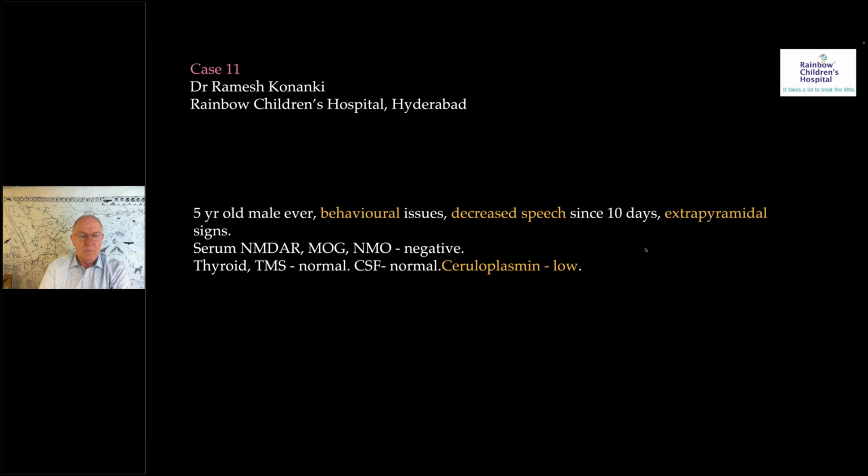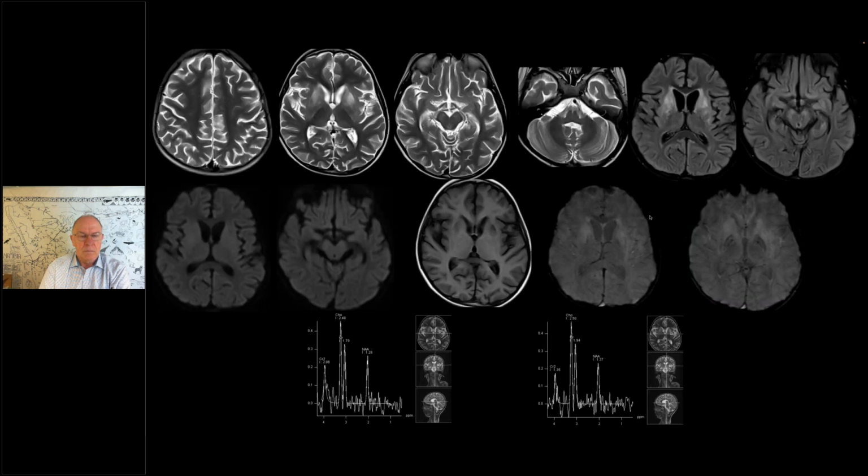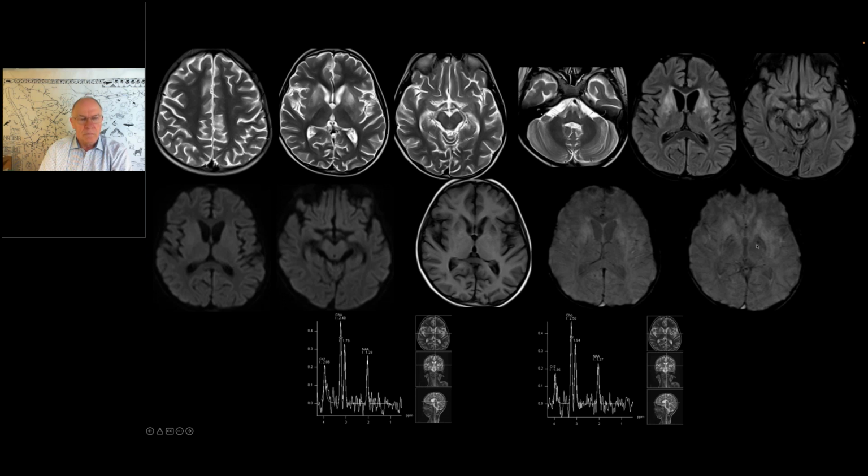Okay. So I have the second scan, and on the T2-weighted sequences, you can appreciate that there is global reduction in the cerebral and cerebellar volume, and there are heterogeneous patchy hyperintensities involving the bilateral basal ganglia. Also slight hyperintense foci in the cerebral peduncles, which can be appreciated on the FLAIR images. Again, hyperintense change in the basal ganglia, but patchy and non-confluent. No areas of restricted diffusion. Nothing on the T1-weighted sequences. On SWI, there is slight increase in mineralization in the bilateral globus pallidus.